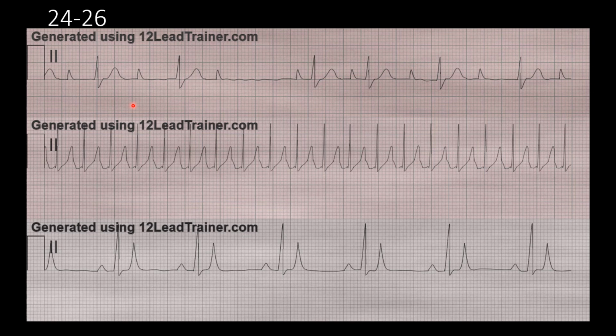And so with that, I'd probably call it a sinus rhythm, even though those look like pointy P waves, just because they're unifocal, and again, just with experience, I would call them sinus, honestly. So this is probably a sinus rhythm, but we have a second degree type 1 atrioventricular block, which is affecting regularity.